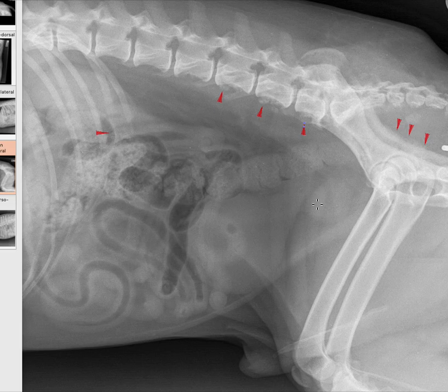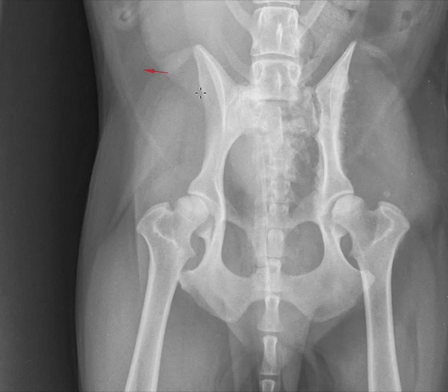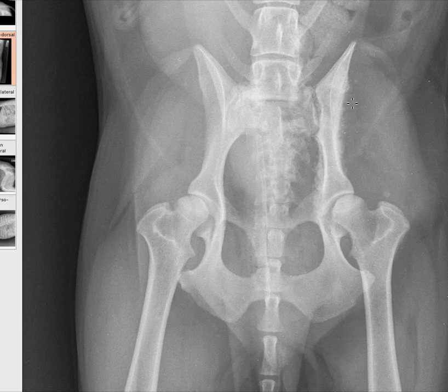The next thing that I look for when I'm trying to determine if a lesion is aggressive is bone lysis. Bone lysis in this case is most evident probably here, where when I trace the ilium on the lateral view, instead of having a continuous line, I actually see a radiolucent defect. The bone lysis is somewhat less apparent on this view, probably in part due to superimposition of the periosteal reaction. This can be tricky with aggressive lesions. When a periosteal reaction and bone lysis are both present in concert, the two-dimensional appearance on the radiograph can be quite difficult.